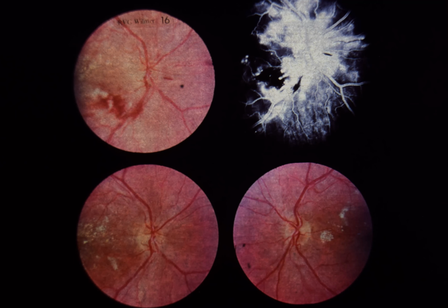Slide 16. Optic disc edema, and hypertension. This 51-year-old female experienced the sudden onset of dizziness and blurred vision in both eyes. Visual acuity was 20/50 right eye and 20/30 left eye. The right visual field showed enlargement of the blind spot with a small central scotoma. Upper left. The right optic disc is edematous.